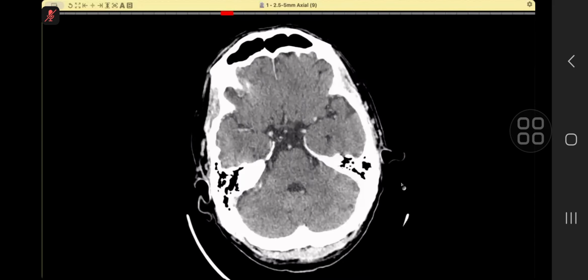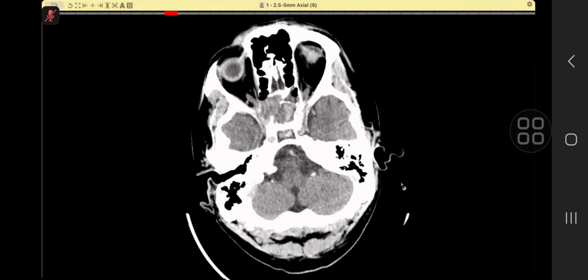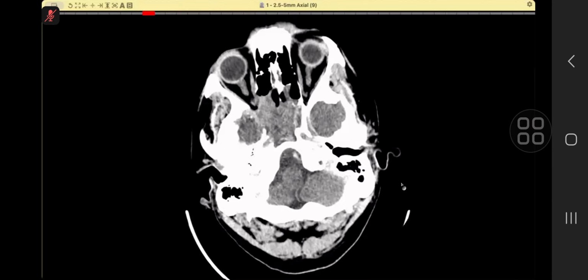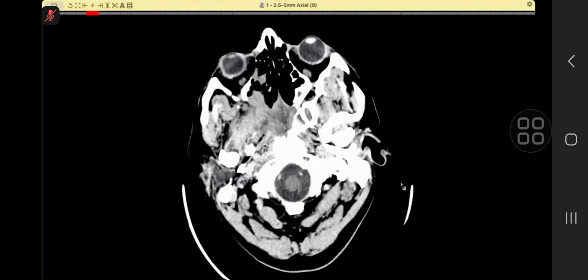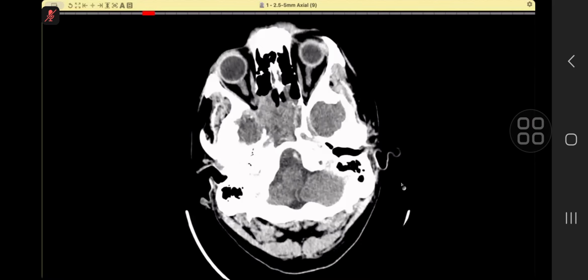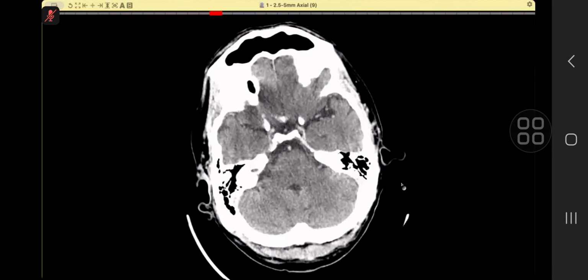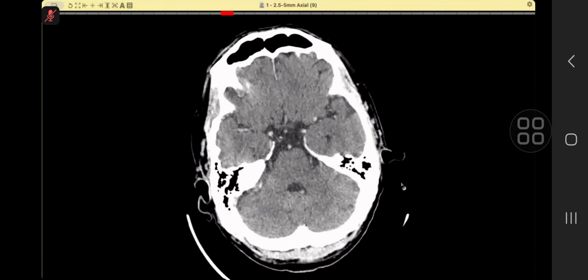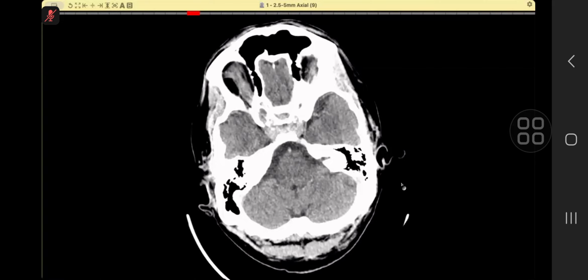Over to you. I've been presented with the CT scan axial section of an adult post-contrast study, in which I can see. First, I would like to scroll the whole stack and then. Okay, just concentrate on the base of skull because of time factor. Yes, sir. But that's good practice what you have told us.